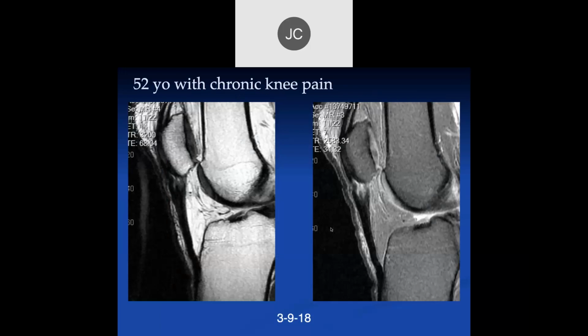So here, increased signal in the proximal patellar tendon. This is chronic knee pain. So I'm seeing intact fibers on the T2, so maybe some tendinosis. Yeah, so these kind of get chronic pain, you get stretching and so forth, you get partial tears, you end up with those microscopic tears and tendinosis. But if you continue to have strain on it, then those can coalesce into bigger tears and you can get partial tears. So this was called a partial tear, that inferior surface.